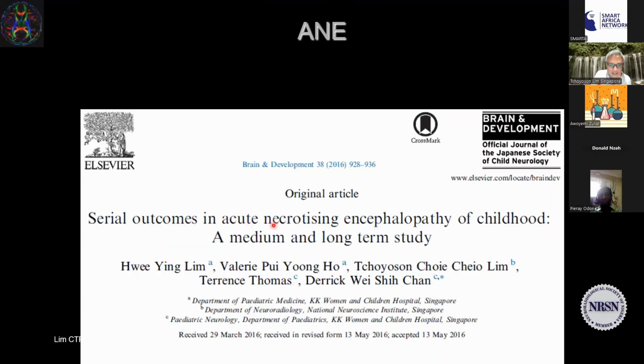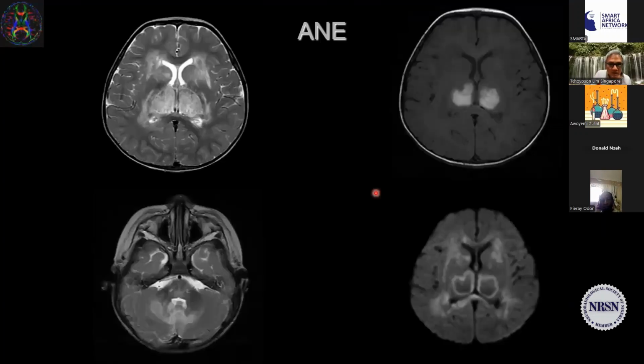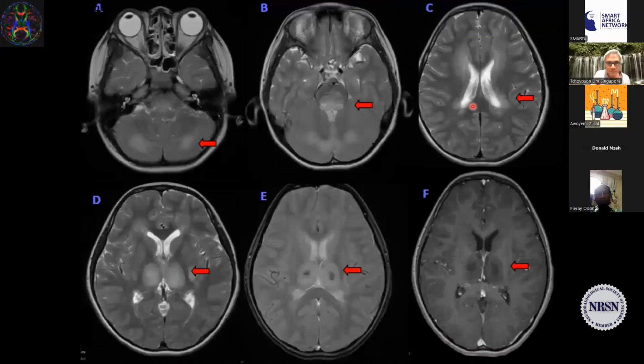Acute necrotizing encephalopathy, particularly in childhood and post-infection, typically affects the basal ganglia around the thalamus bilaterally, and they can also show abnormal signals on DWI. There may be other involvement of areas, and they finally may have hemorrhagic leakage of blood products as seen here on T1 weighted high signal intensity from methemoglobin. These are other examples of ANE with high signal intensity and susceptibility on GRE.